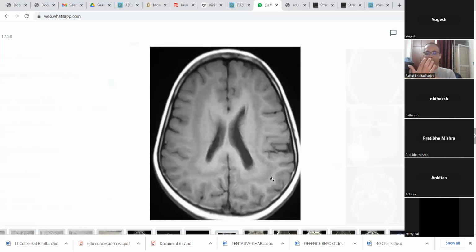So as you said, if it just escapes the ventricles, then it can be periventricular, then it can be like a band in the white matter, or even peripherally, in which case it may not be a band. What heterotopia? The subcortical. No, that is about the location. Even bands can be present in the subcortical location, in the middle of the white matter, then it can be along the ventricles. And this is an entire band-like thing.